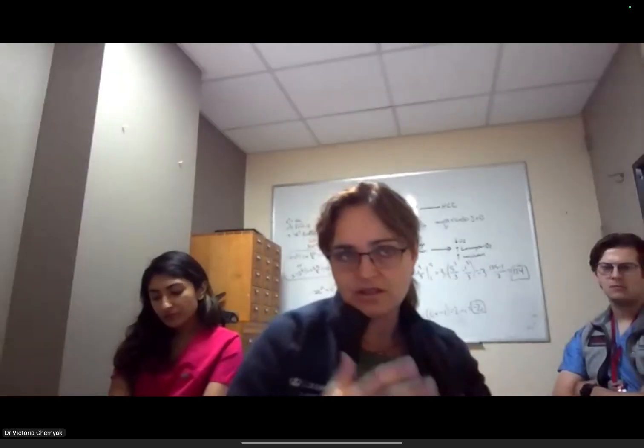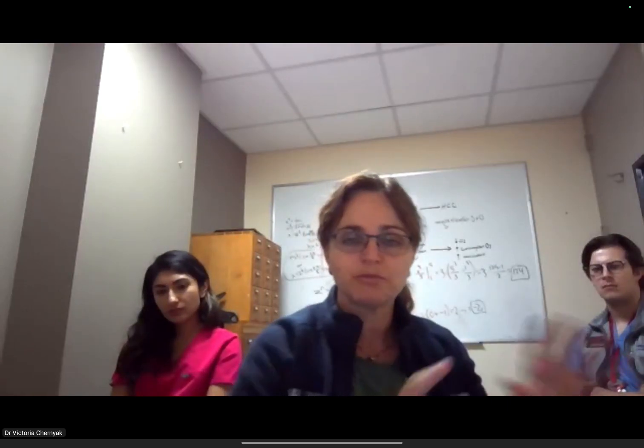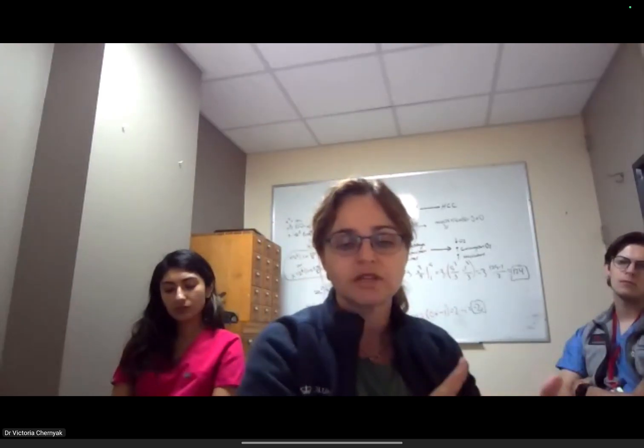Well, the conversation whether extracellular or hepatobiliary is better is very involved and can get very contentious, because some people strongly believe one way versus another. According to LI-RADS, there's no preference, right? LI-RADS says you can use either one. Now that may possibly change in the next release if we have enough data to show that hepatobiliary phase hypointensity is a major feature, but it won't be that you have to use it. It will be just that the category application may be slightly different.